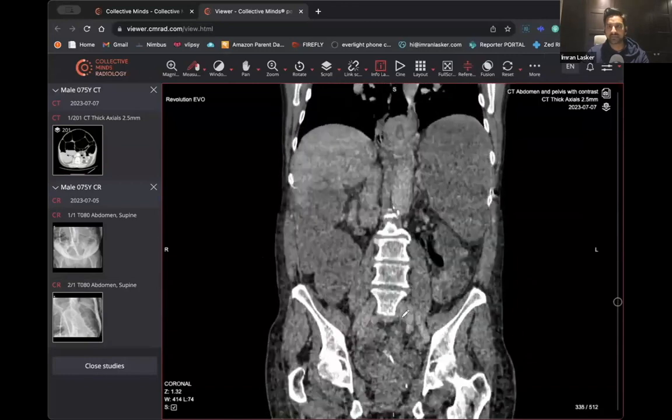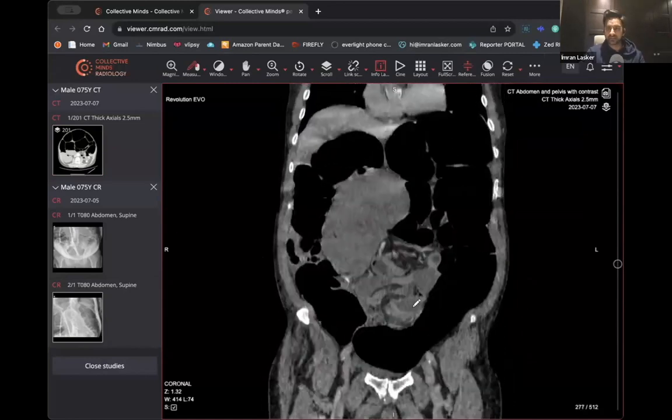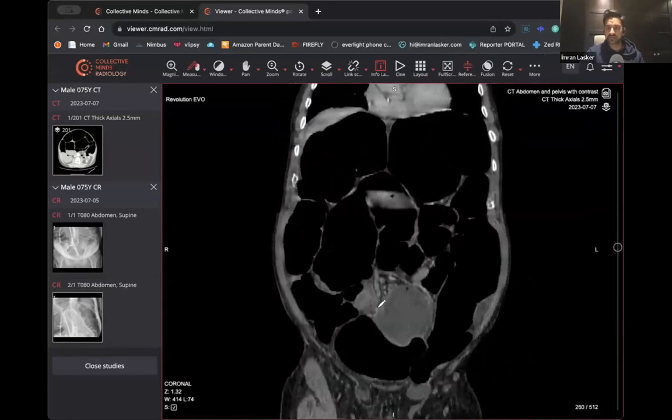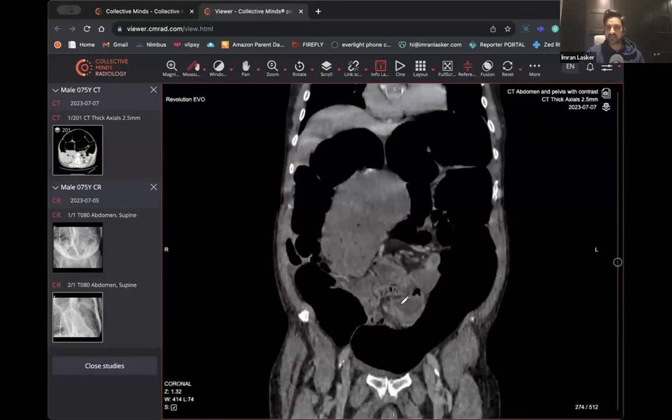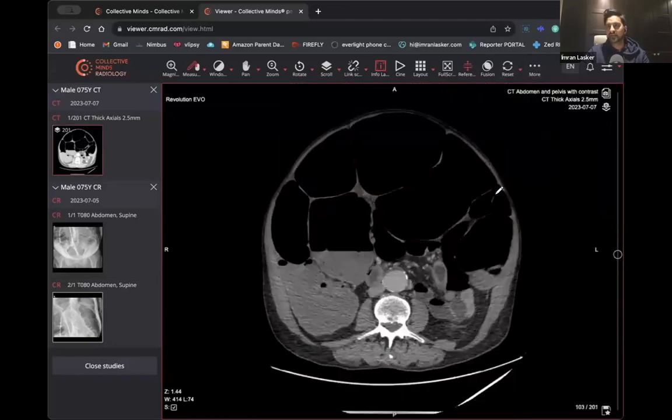And that little twist is pretty much the volvulus. That's where it twists on itself, and then you get that obstruction. See, it goes like that, and then back again, and it's like a whirlpool sign. That's genuinely what they would call it, a whirlpool sign. And so now you pretty much know that this is a sigmoid volvulus, right?